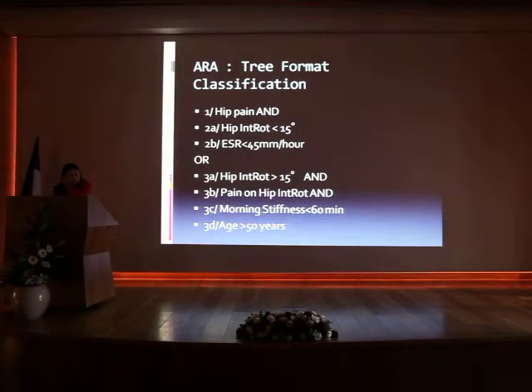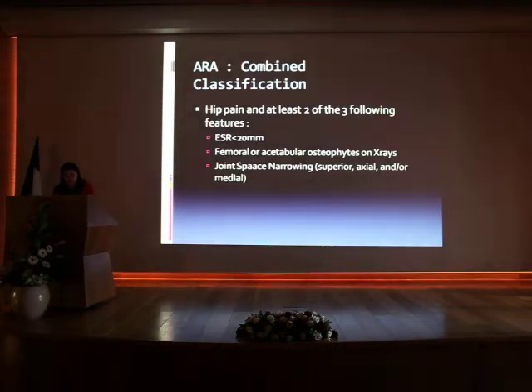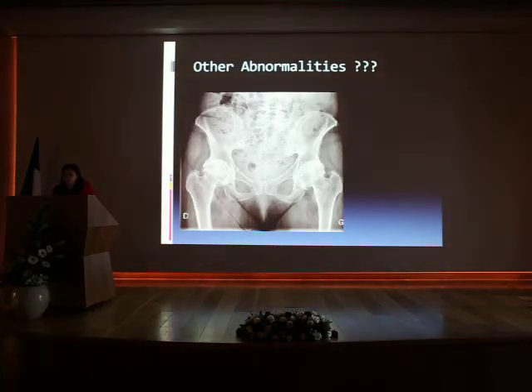Here's a little word about the classification of DJD of the hip. It was clinical, and now there's a combined classification associating imaging criteria also. Can you go further with the hypothesis of the lesion? Is it a primary osteoarthritis, or is it due to something else, based on this plain film? This is actually a complication of osteoarthritis, but it can cause the osteoarthritis.